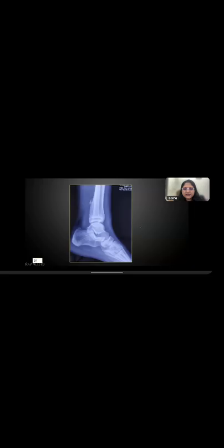Case number 31. Easy to identify. See, this patient's birth date is 9/11/2008. The radiograph is 2023. Okay, osteochondroma. No, no, don't say osteosarcoma. After so much of explanation, you have to say osteochondroma. Yeah, okay, osteochondroma. It looks like a benign lesion which is growing away from the joint. So, osteochondroma. Right.